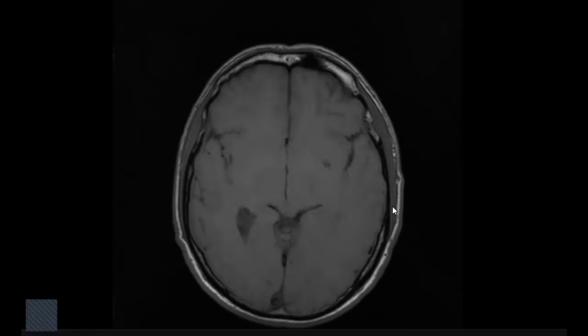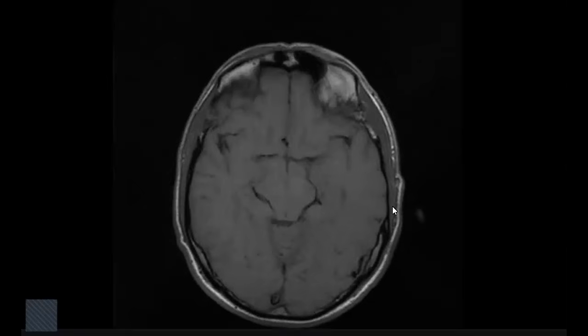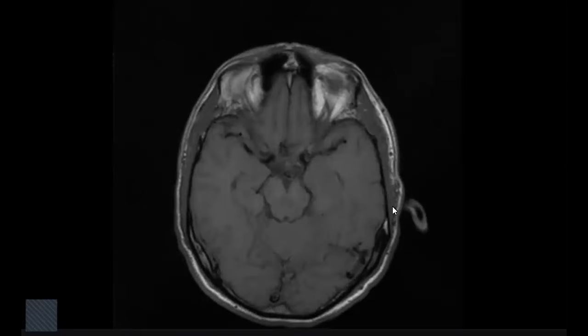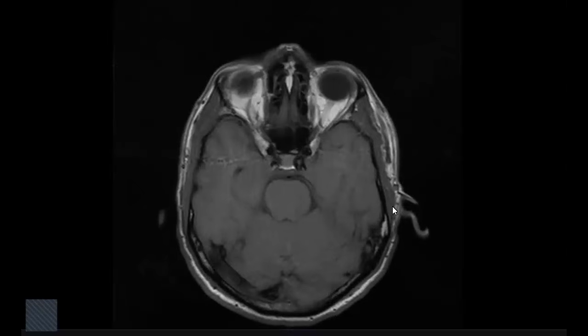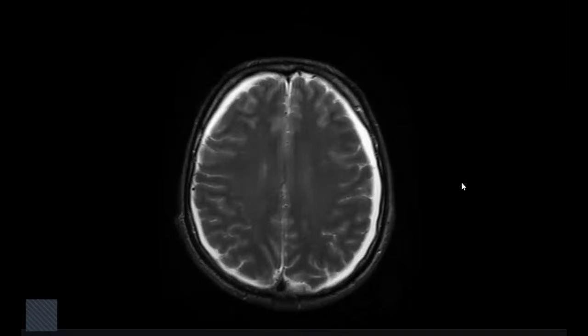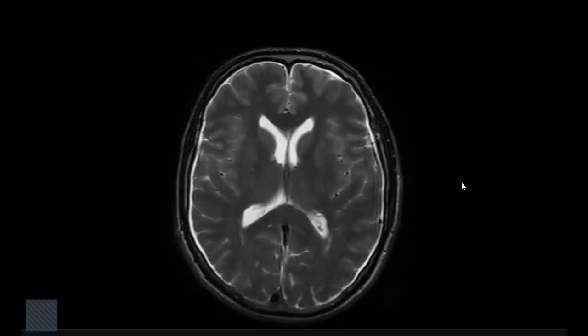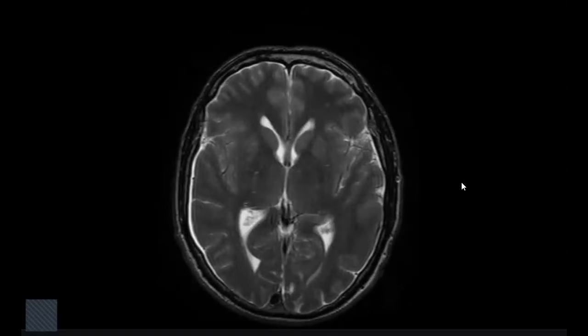Yes. Okay. So, I'm trying to look for the bone window also. I'm trying to look for the bone in the T1. Okay, what will you do next? I wanted to look for FLAIR or any other sequence for this patient. Okay, here's the T2. In the T2, just 1 second. I can appreciate that there is evidence of, I will have a look and then I will comment.